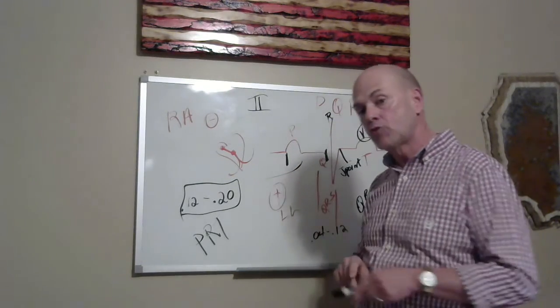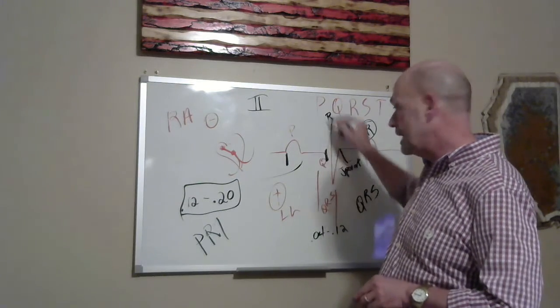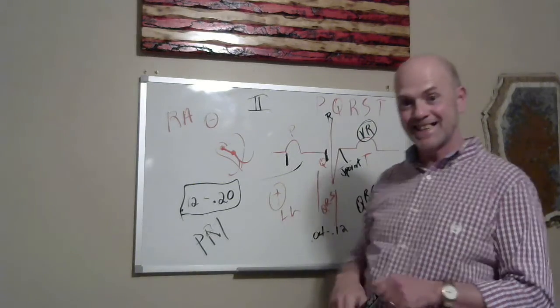We don't see atrial repolarization. It's likely hidden inside this QRS. Well, not likely, it is hidden inside this QRS.